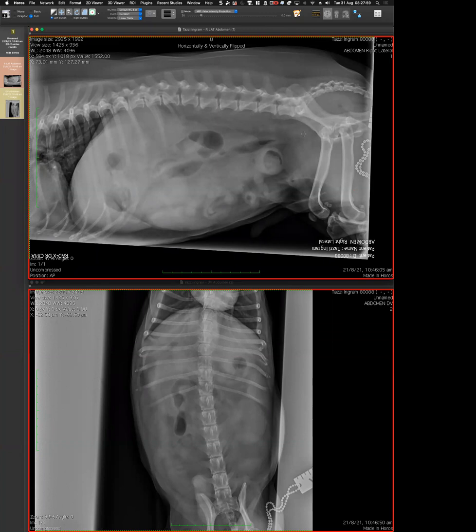Right, okay, I know what this is. And I guess then looking for signs of, what's the motility of the gut? Does there look to be a foreign body? Is there an intussusception? I'm trying to A, work out anatomically what it is, and then B, get some more information about what it is that's causing the pathology.